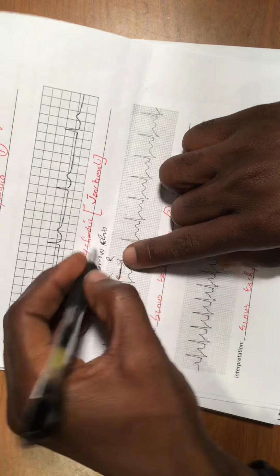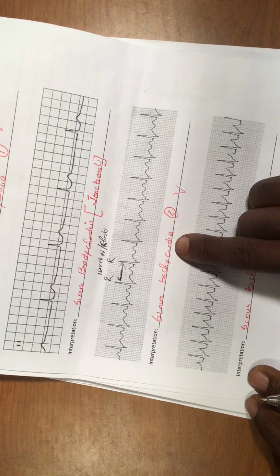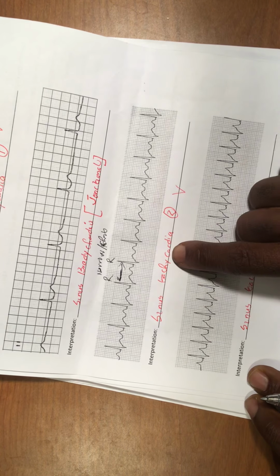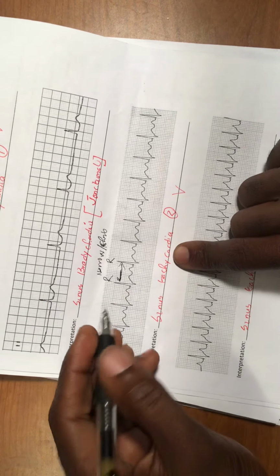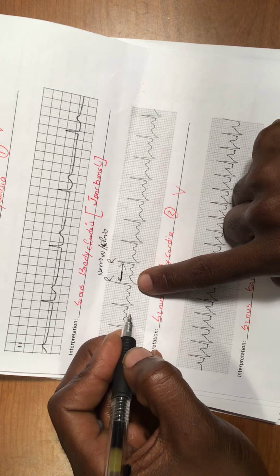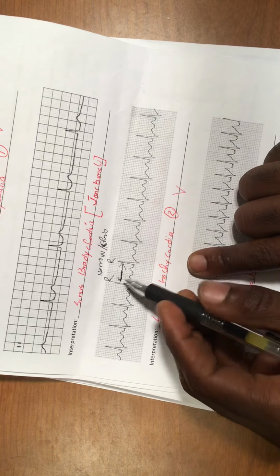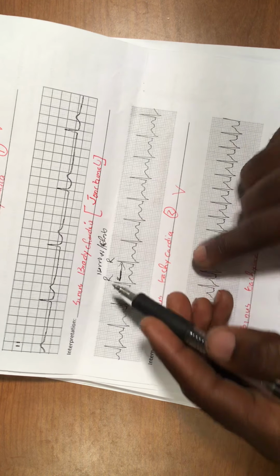It's really narrow or short. And this is the reason why they talk about sinus tachycardia, or sinus tach. And we will talk about it. We'll tell you why exactly it's sinus tach or why exactly it's not sinus tach. This is very, very important. And you can see it again. So you see the R to R interval, it's really narrow.